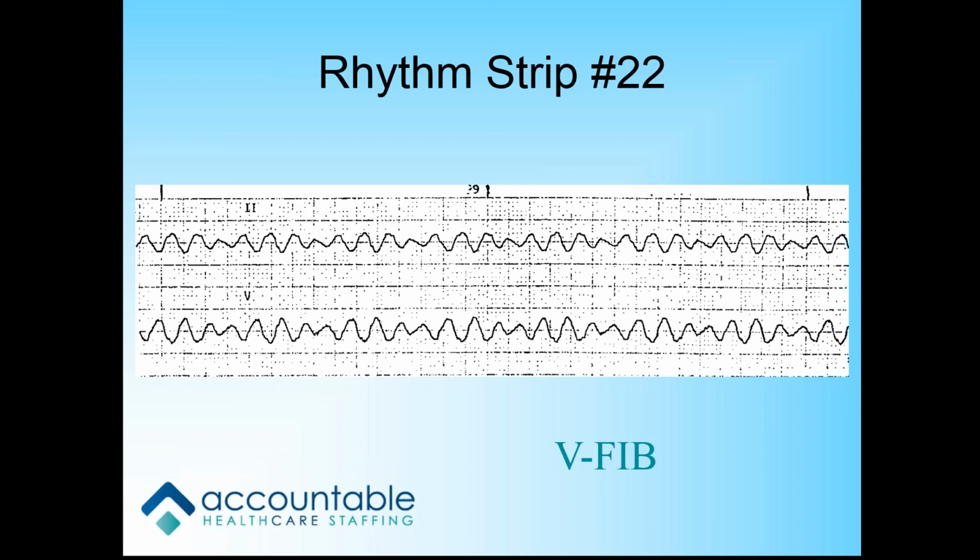Their best chance of surviving is delivering electricity. So if you ever get a question that says, what's the first thing you do for a rhythm like this? It is getting electricity. You're going to shock them first. That's their best chance of surviving. Okay? Good job.